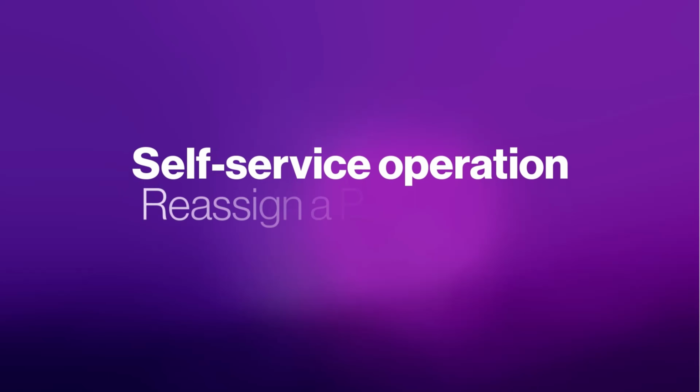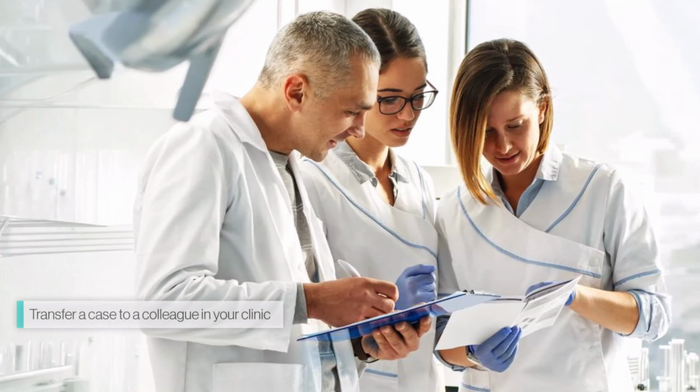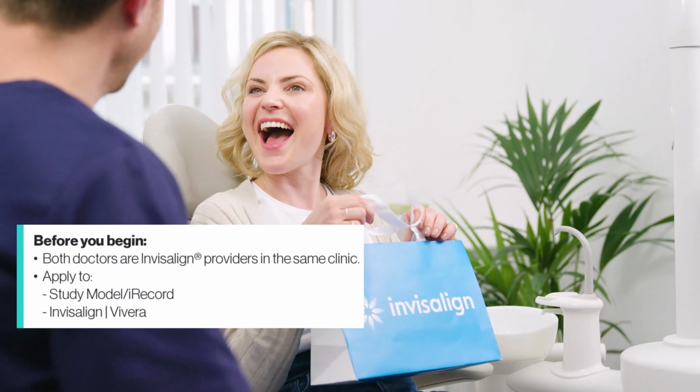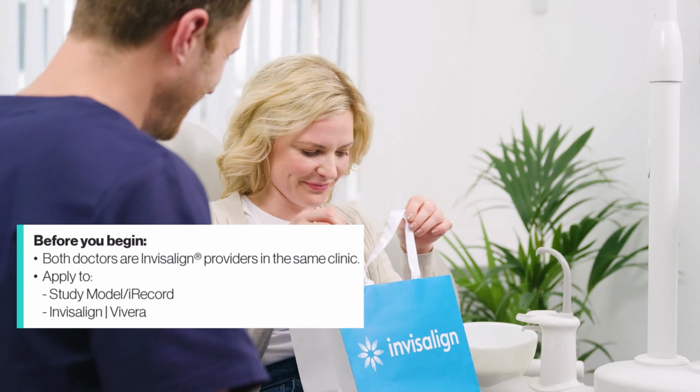In this video, we'll walk you through how to reassign patient cases using the Reassign feature on your iTero scanner. This feature is designed for cases where you need to transfer a patient's files to another doctor within the same practice. Both doctors must belong to the same clinic and be Invisalign providers who perform orthodontic procedures.